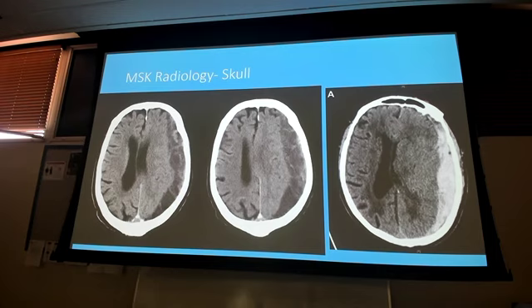Let's say we didn't see the chronic. Let's say we didn't see the acute even. If I do my midline, look at this. I go straight down. I got part of this ventricle spreading over midline over this way where it shouldn't be there. I should have one ventricle, one ventricle. Here, this one over here, I got a whole ventricle there, but my midline is kind of like this. It kind of comes down like that. But you can see the mass, and it's all pushing and bulging over. It's that mass effect.